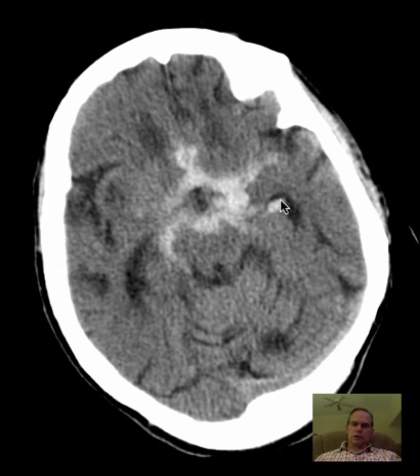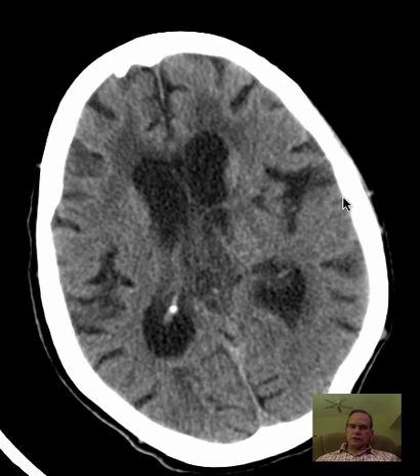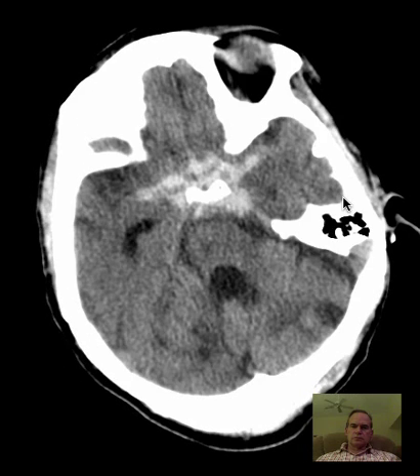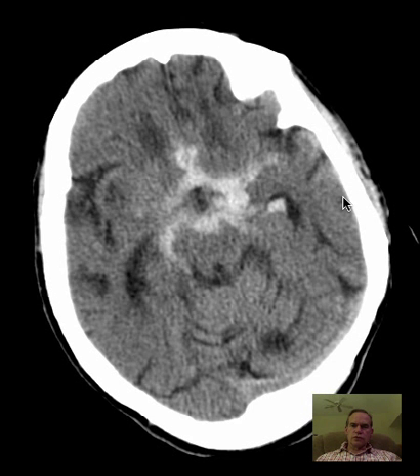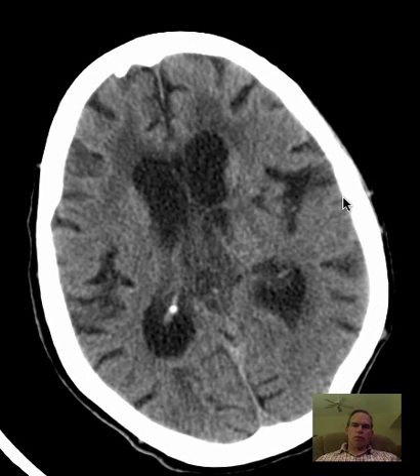And a small amount of blood has also gone into the left lateral ventricle, and you can see that there are little tracks of communication between the suprasellar cisterns and the ventricles through this region right here, and you can actually see the path of the blood from the suprasellar cistern into the left lateral ventricle. Here you can see two components of those two areas. So this is a classic subarachnoid hemorrhage. Hemorrhage in the suprasellar cisterns with a small amount of intraventricular extension of the subarachnoid hemorrhage.